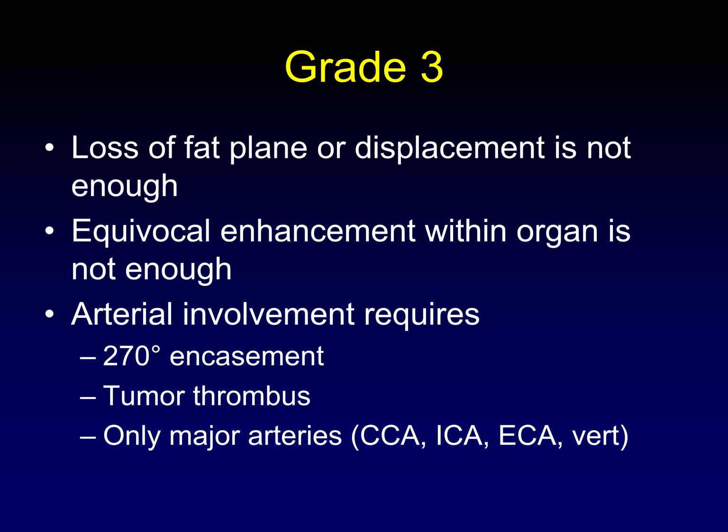You need to see the tumor extending in, finger-like projections destroying the parenchyma of that organ. In the arteries in particular, we want to see encasement. How much encasement? Well, 270 degrees that we often used to declare definitive encasement of an artery still works here. So 270 degrees around the artery is considered encasement.